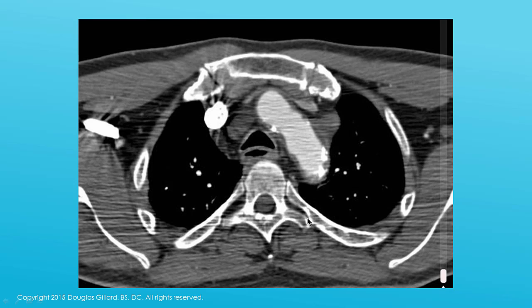There's the articulation with the transverse process here. And there's the articulation with the body here. Pretty cool. I could label this maybe. Well, this is the vertebral body. These are the pedicles, right? And this whole thing is the posterior arch. You can actually see the spinal cord right here. See the shadow of the spinal cord?